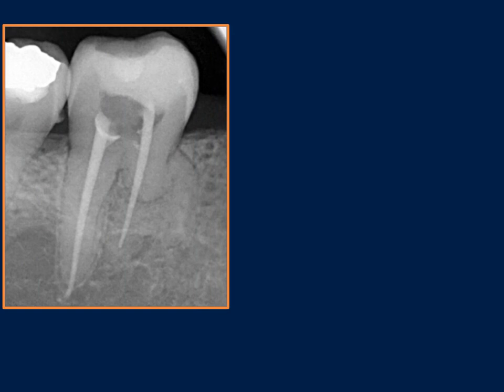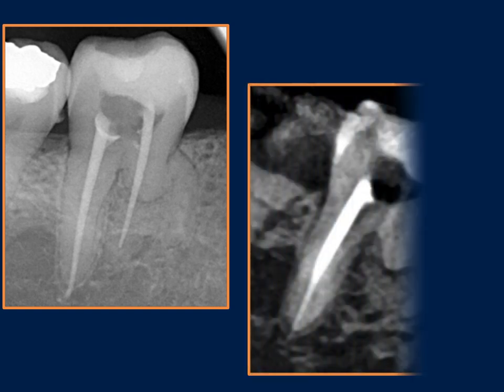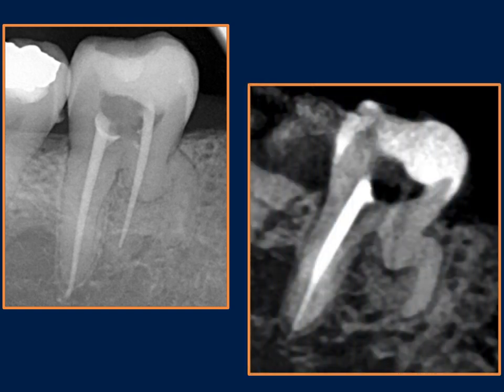Like this tooth here, I need additional information with CBCT. It showed me we are dealing with a difficult tooth. So think twice before entering inside such teeth, and always think, when you need additional information, take CBCT.